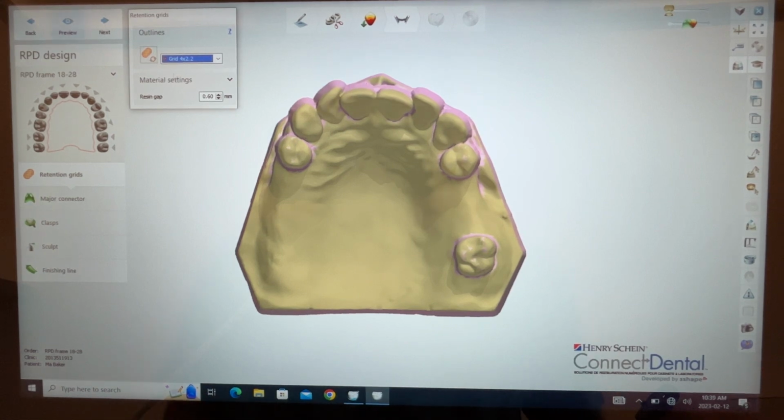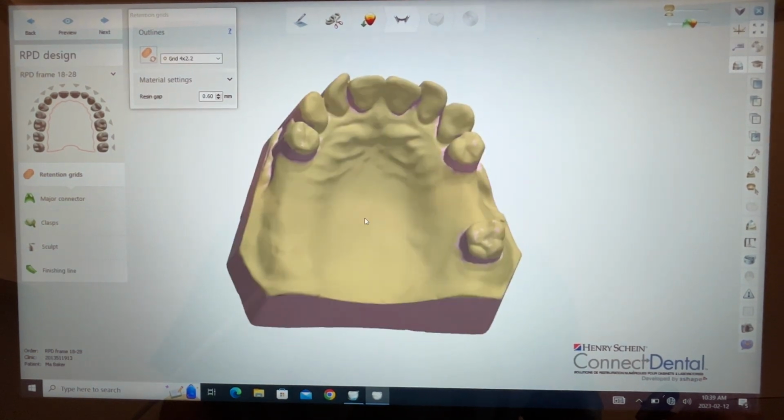And now, what we have to do to design this is outline our mesh retention grid here. But in order to do so, when I hover over the icon, it looks like a Band-Aid, the mesh icon, I think I have to click it. Oh, then I get my pencil. And then I can left mouse click, and this spline, as it's called, I can move that later.